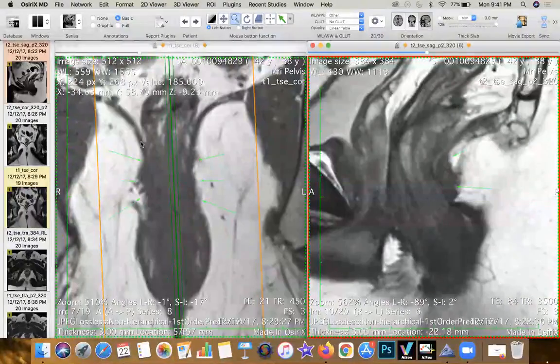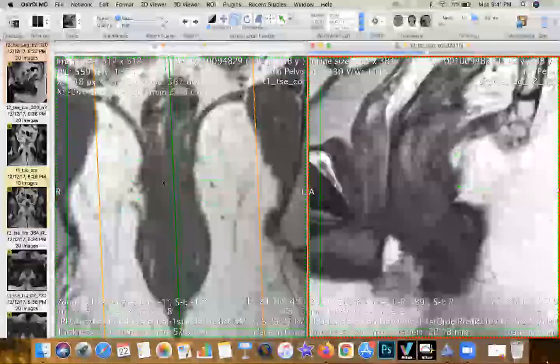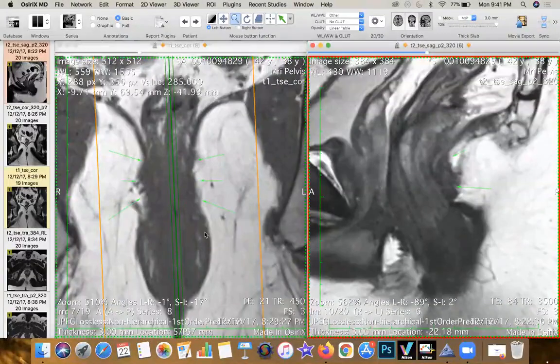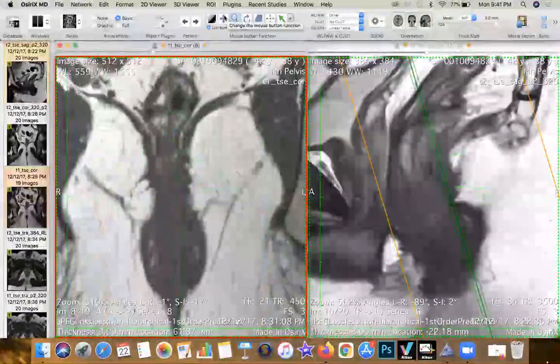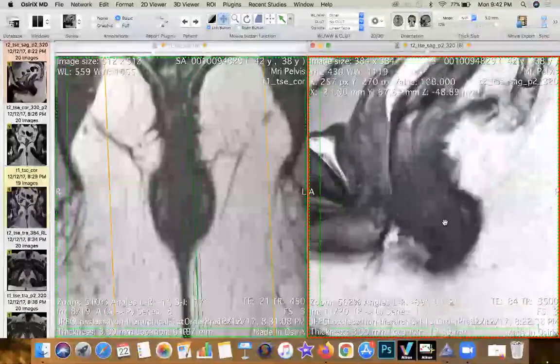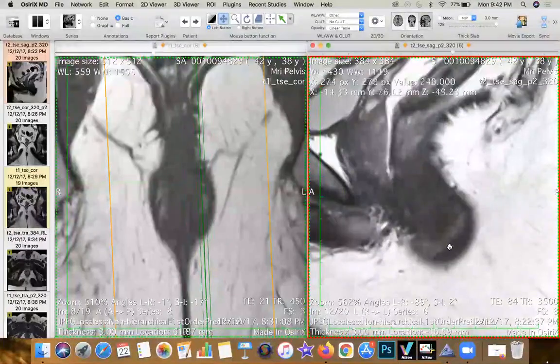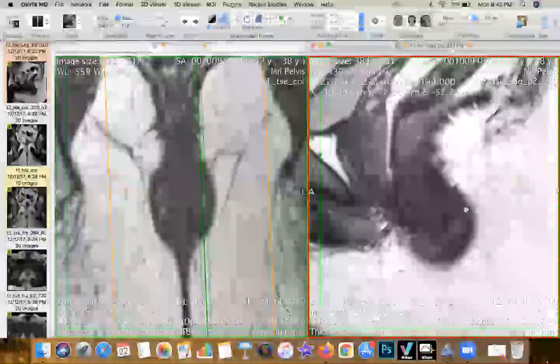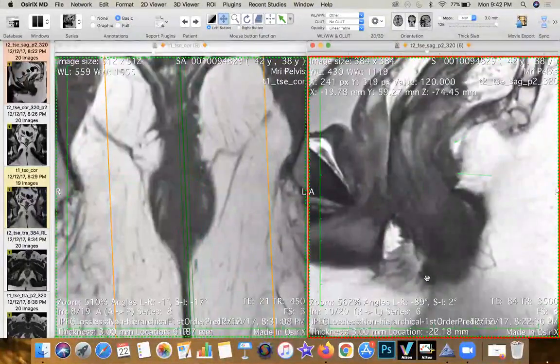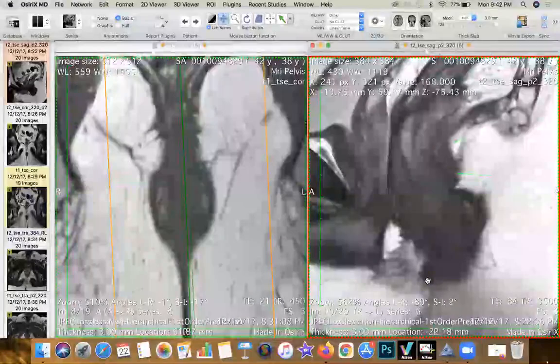So once you're done with the levator ani, the second thing is the puborectalis. The third component is the external sphincter complex. The external sphincter complex is divided into three components. The lowermost component is located at the level of the anal verge. So this is the internal sphincter. This is the anal verge. This is what we call the subcutaneous fibers of the external sphincter complex.